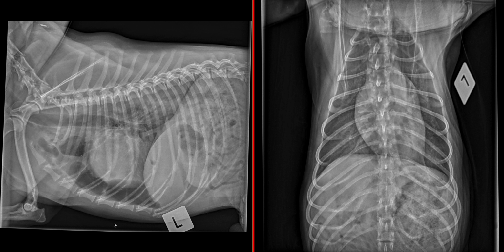In lateral recumbency, the middle lung segments may not have the same capacity to expand with the presence of pleural gas. This can result in atelectasis of the right middle and the caudal subsegment of the left cranial lung lobes. When these lung lobes are atelectatic, they cannot appropriately buoy the weight of the heart. And therefore, we see that there is displacement of the apex of the heart, resulting in the cardiac silhouette falling dependently away from the sternum. This creates a gap of the silhouette and the sternum where we observe air opacity.